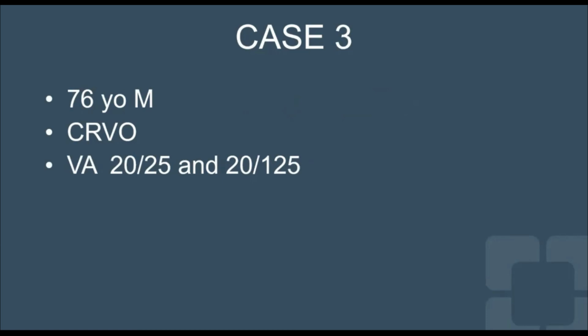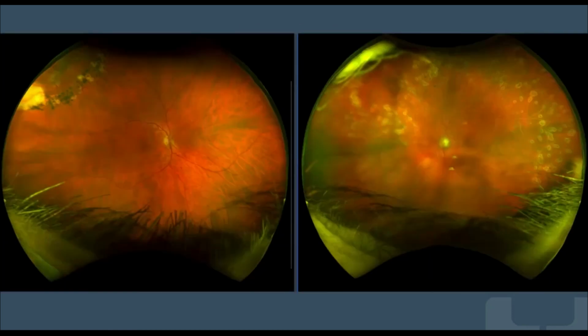This patient initially presented with significant macular edema with both intraretinal and subretinal fluid, and has undergone several injections of anti-VEGF agents. And his vision kind of stayed the same. And this is what the images look like. We can see here a wide field image of the right and the left eye. And on the right eye, he has a horseshoe tear that has been treated with laser, but otherwise looks normal. On the left eye, we have a view of peripheral PRP and some ischemic vessels.